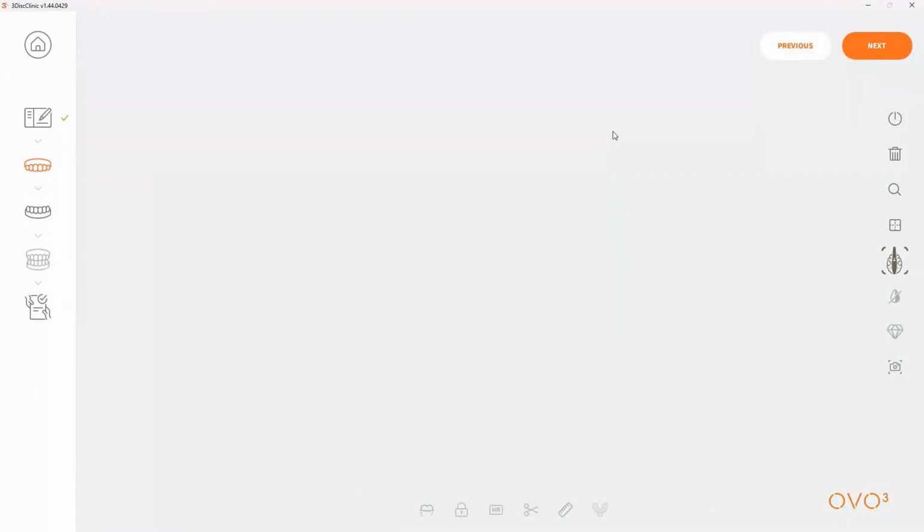Right now we're going to address the live screen view. You'll see here that we're within our first scan stage. Over here on the left-hand side, I'll move my cursor over there. You'll see that we start with the order form set up. And if there's a green check mark next to it, we know that there's actually data there and that stage is complete. Whatever stage we're in will be highlighted in orange.